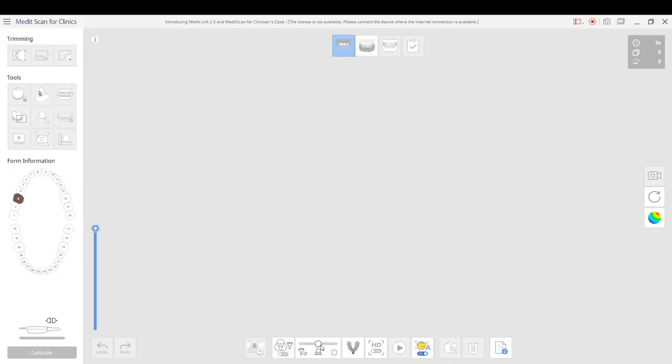Next to this filter, based on how good your graphics card is, basically what you're trying to do when you're imaging is balance the amount of information that's coming in with good data, and you want to avoid picking up data that you don't need. So the tongue that's moving, you don't need for an intraoral scan, so you can use a variety of things like a rubber dam or an Isolite or your fingers, and use these filters to weed out things that you don't want.